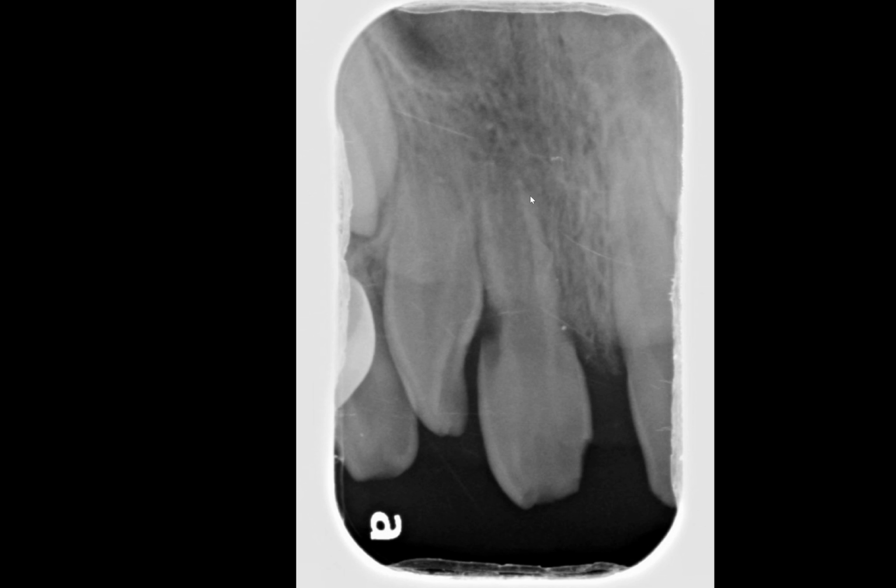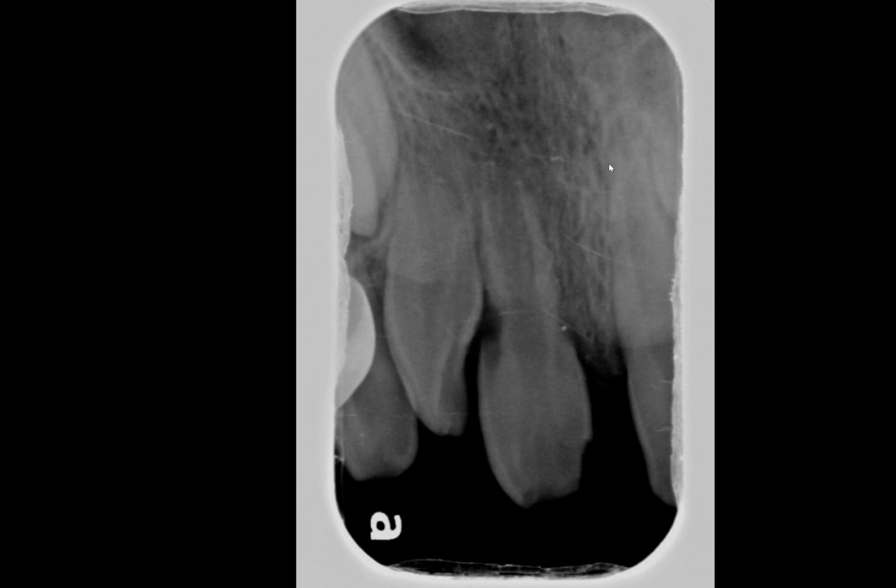Look at the apical area, wide open foramen. Okay, it failed to close, or it failed to develop the root. Unlike number 9, not affected from trauma, and the periapical region has been formed nicely, and then the canal is almost closed, or the pulpal space is almost closed.